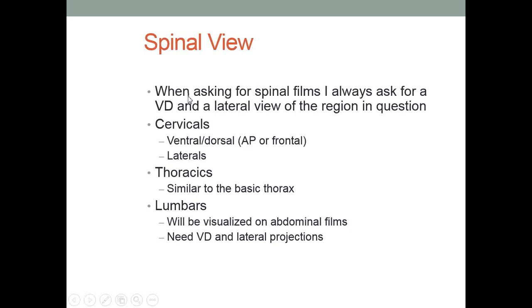Spinal view. Again, I like a VD and a lateral view of the spinal area in question. I like these before I adjust them. Again, I'm looking more for contraindications. I'm also looking for pathologies, so I can sit down and discuss these with the owner.